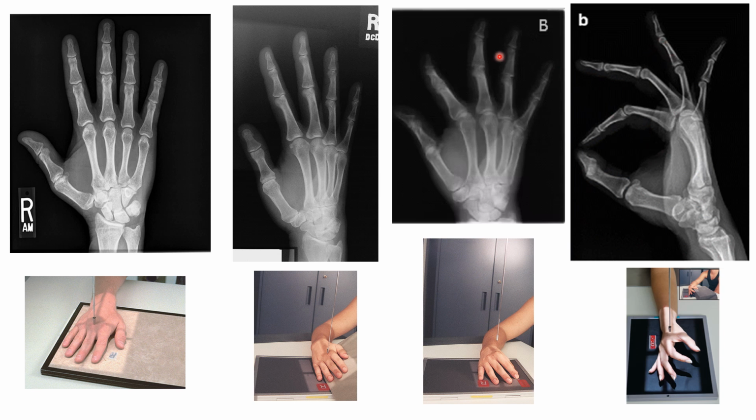Now, I did not discuss that back here in the obliques, so let's pop back over to this oblique very quickly and describe the rotation of the phalanges here. With the obliques, we should say that we can see more concavity on that anterior side than we do on the posterior side. And then we'll also describe that we can see 2 times the soft tissue margin on the anterior side of those phalanges than we do on the posterior side. That's another way to judge our rotation on our oblique hand X-rays.